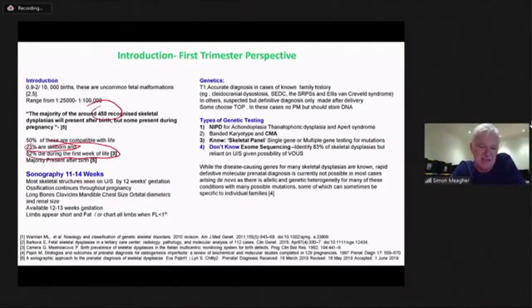The skeleton, as you know, is formed at that stage, but you say, yeah, the ossification or description of the shape of the bones, the morphology. Well, I'd say actually that is well described. And if you look at the skeleton and pay attention to it, I think we can improve our detection rate, particularly for the lethal skeletal anomalies.